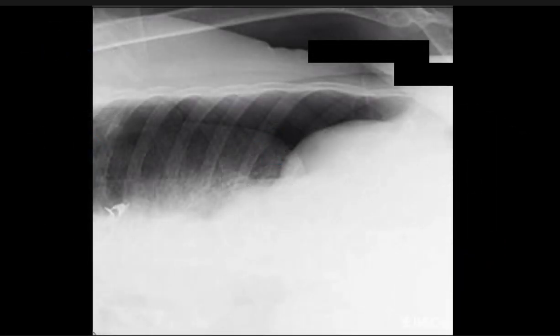All right. So here's an example. Also, it's a pretty good one. And again, you can say, boom, right there. You can see that very well. And extra lucency right here. So sure enough, that is positive. That's what positive would look like.